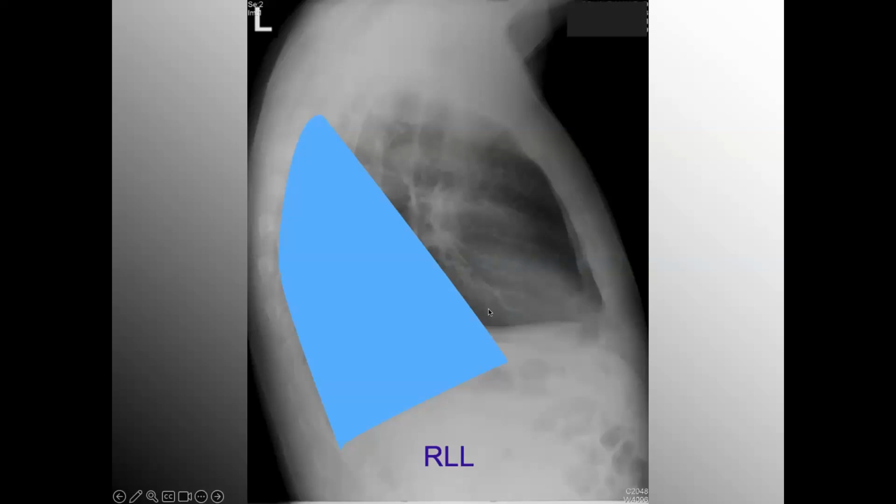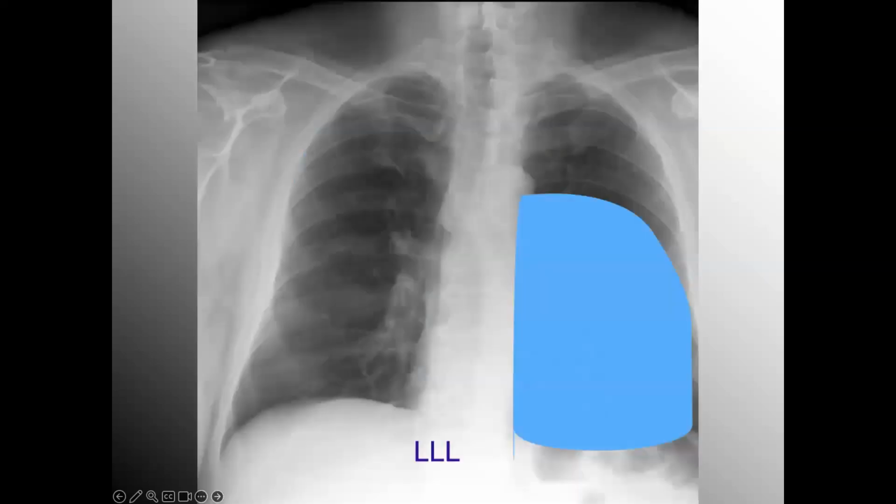And there's not too much anterior except this particular portion right here. A good rule of thumb is if you have air in front of fluid, usually the air area, the lucency, becomes somewhat opacified. But if you have fluid in front of the air, you can't really appreciate the air because the fluid is always radiopaque.